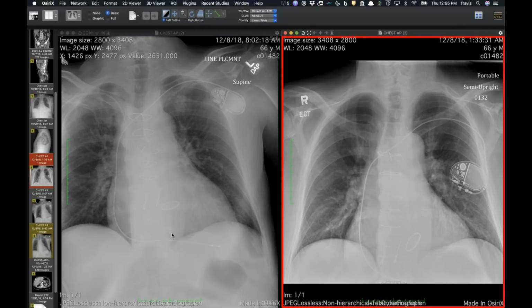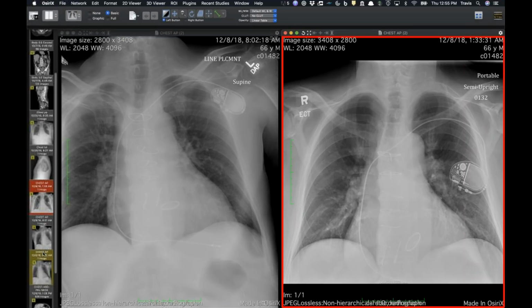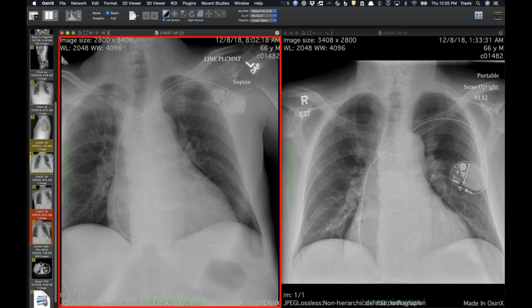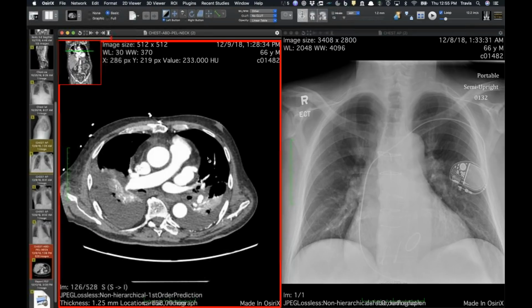So what do you guys think? I've watched these valves rock on fluoroscopy. It's really amazing. You can see that they're hinged at one point and then they're just flapping like a door opening and closing. Yeah, dehiscence. But Travis, you recently showed the dehiscent valve. What's that? You recently showed us the valve that dehisced. I've shown a couple.